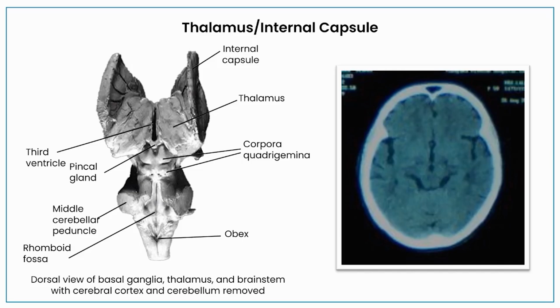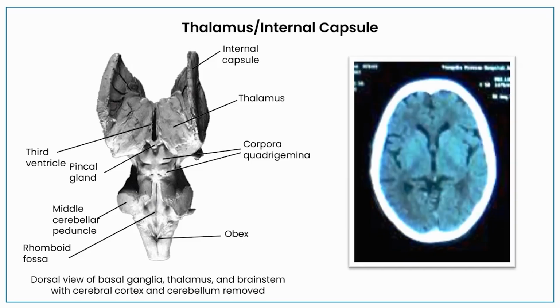This is nothing but your quadrigeminal cistern, or the other name for this is actually smiling cistern. As you can clearly see, there are two eyes. This is your third ventricle and this is your smiling cistern or quadrigeminal cistern. So over this, what is going to come? We just showed you in a slide previously. Over the structure you have clearly thalamus, internal capsule, right?